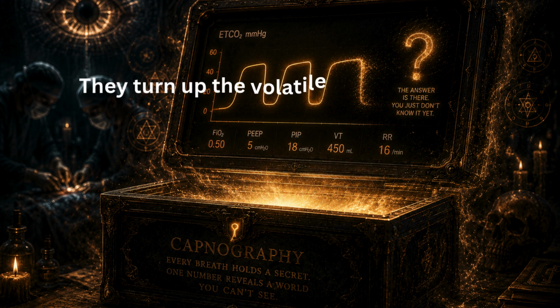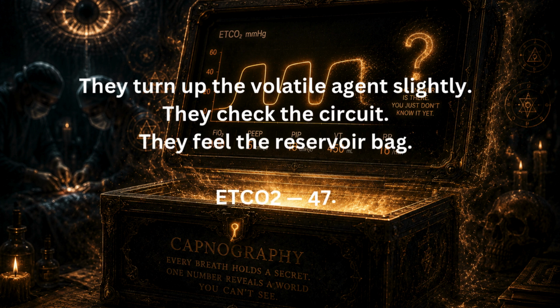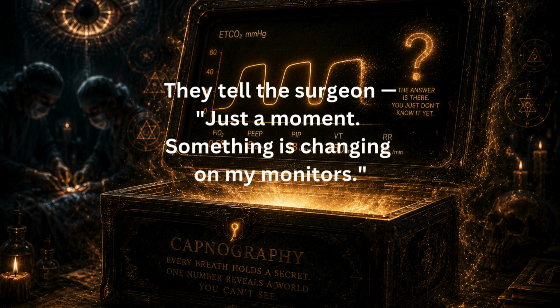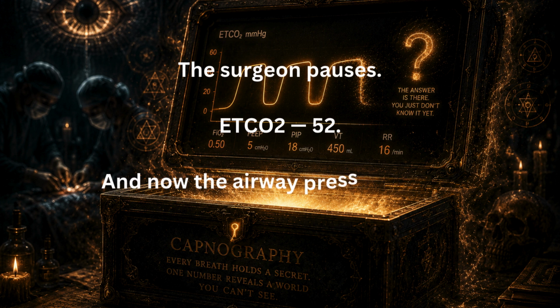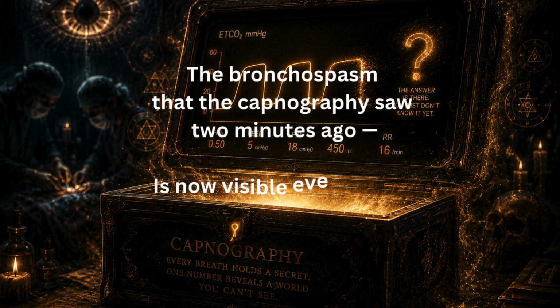They turn up the volatile agent slightly. They check the circuit. They feel the reservoir bag. ETCO₂ 47. They tell the surgeon, "Just a moment, something is changing on my monitors." The surgeon pauses. ETCO₂ 52. And now the airway pressure alarm begins to sound. The bronchospasm that the capnography saw 2 minutes ago is now visible everywhere.